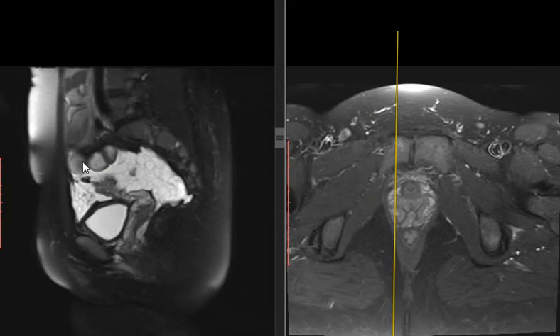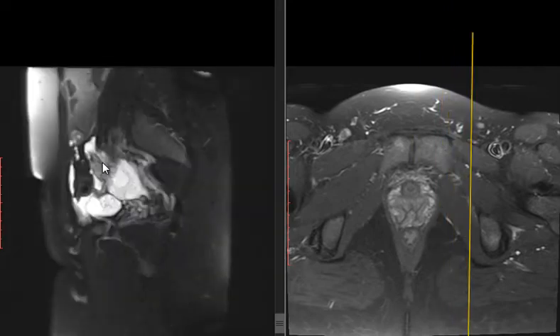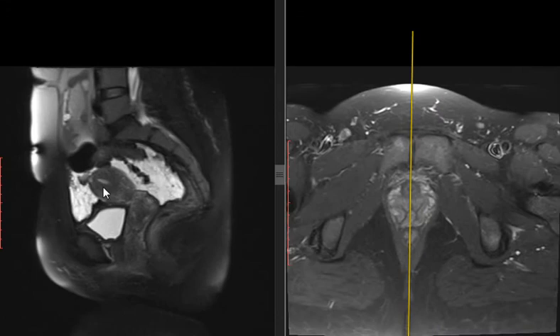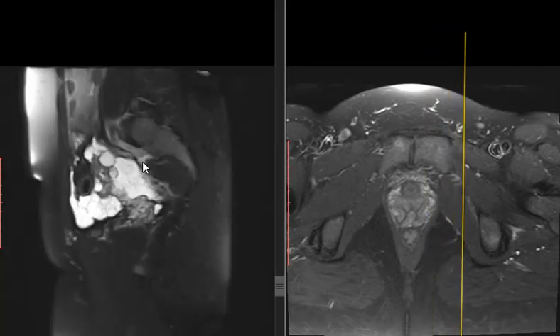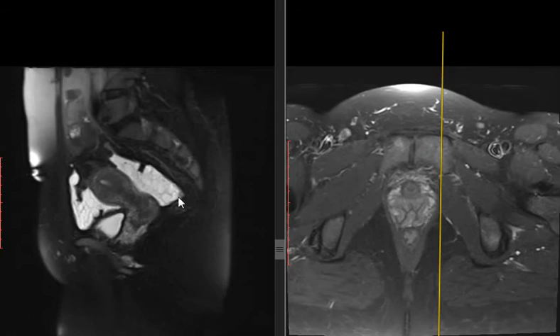Not invading any structure. Is the origin in the bone? No. Infiltrated to the soft tissue? Does the bone look like the origin to you? No. It's a normal bone. I am asking, from the iliac region, from the SI joint region? Okay, but is there any abnormality in the bone to suggest that it's of bony origin? No, I cannot see it.